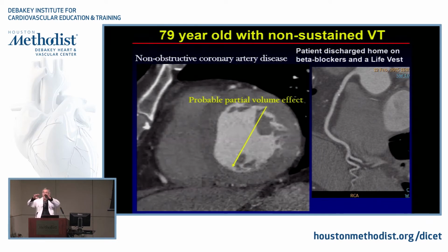And so remembering that the static image is a component of both the systolic, diastolic, isovolumetric, all the phases in the R-to-R interval, you're going to have less counts, relative counts, in an area where there's less regional wall motion or diminished regional wall motion as compared to areas where there's normal wall motion or better preserved wall motion. And so this was simply a partial volume effect in someone with non-ischemic cardiomyopathy due to regional wall motion abnormalities that caused us to say that we thought there was a defect in the right coronary territory, but indeed that was not the case.